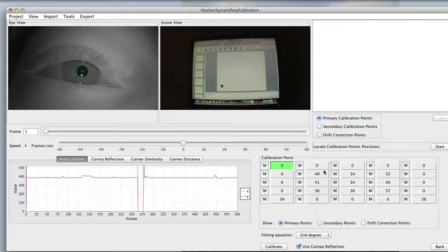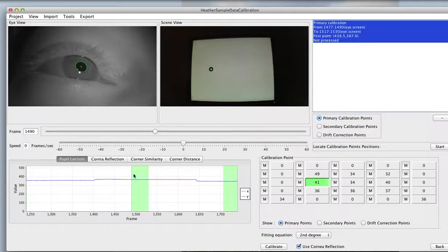Each time we created a sequence here, for example, this sequence right here, we identified a location between the center of the pupil here and the center of where we told the subject to look. And the problem is that that was only true for the first frame because the subject may have moved her head on subsequent frames here. And so we have to get the ExpertEyes program to identify the location of this disk in subsequent frames.